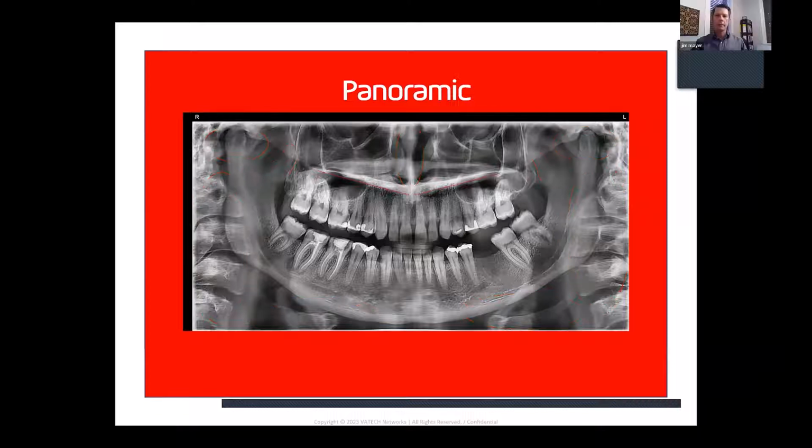Well, let's move to our next slide here. So this is the nasal cavity, and on the pan right there, we can see the inferior turbinates and the nasal air passages, right and left. Actually the right side is narrower than the left, which is sometimes a common or normal finding. It's like a physiological process, and it changes from side to side.